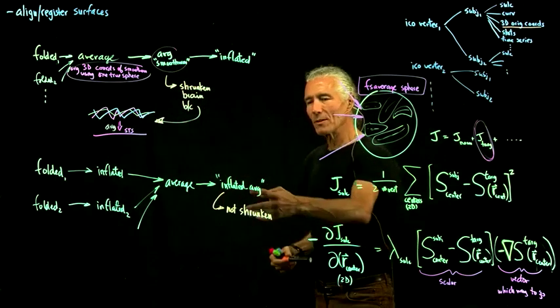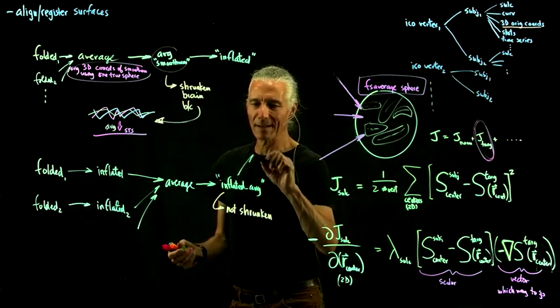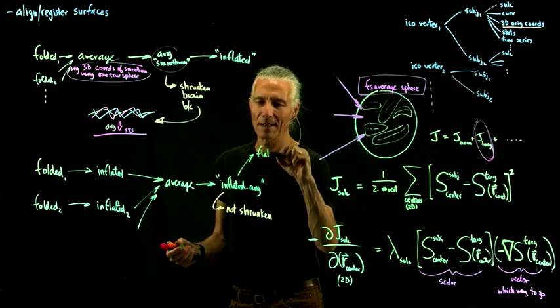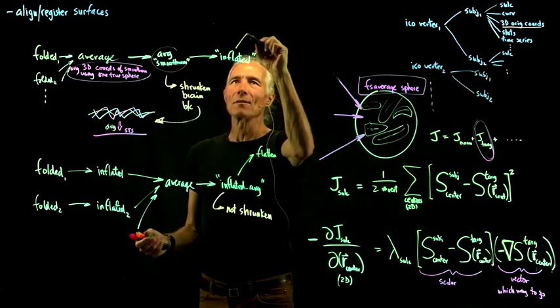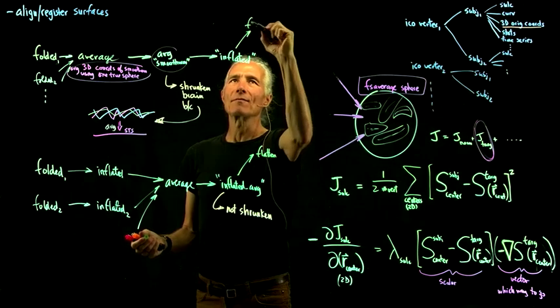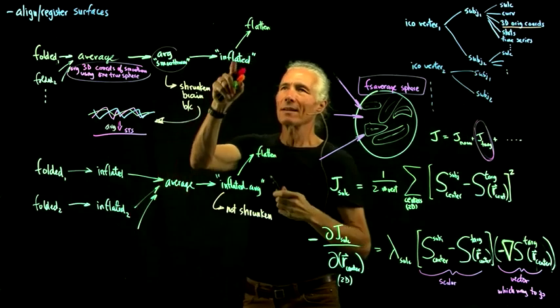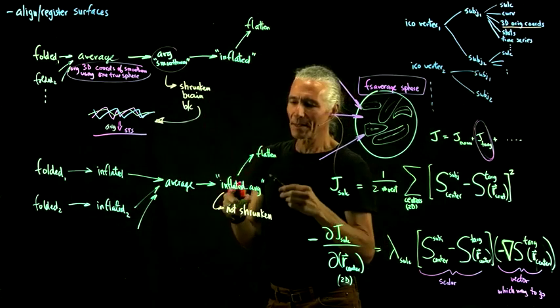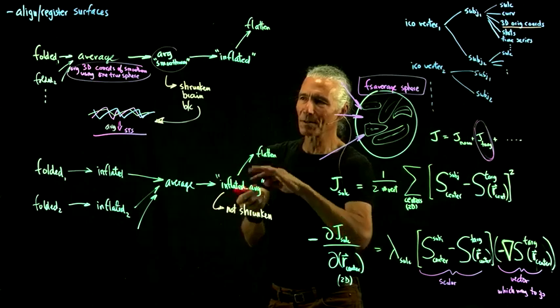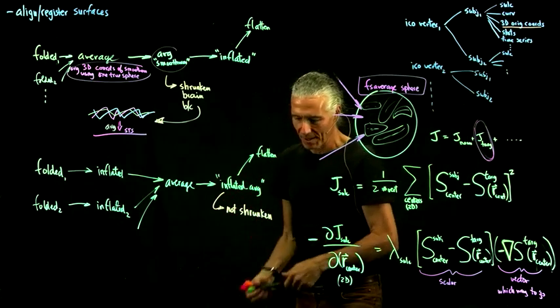But another useful thing for this is you can flatten it. If you want to completely flatten the brain, you'll notice that if you flattened this inflated one, you're going to get a shrunken flattening also. So this is a better surface to use for completely flattening the brain, because it won't be shrunken.